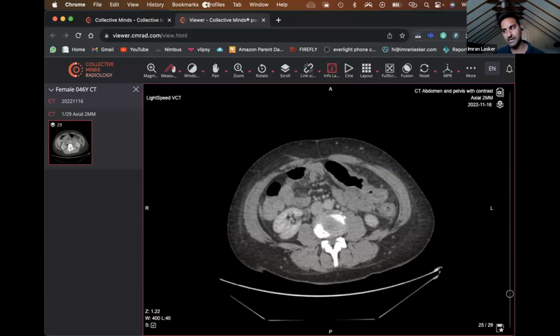And so when it's something like that, and you don't have much in the way of lymph nodes, you've got to start worrying that this could be not just colitis, but something like underlying ischemic colitis. So they may need to keep a watch on the lactate, see how the patient's doing, and have a bit of a lower threshold to go in. So those that said it's colitis, you're right.